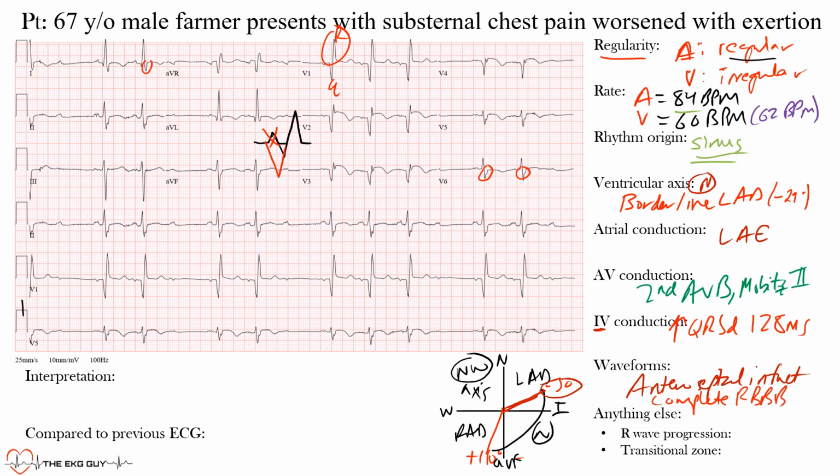All right. Is there anything else? Well, we've hit on a lot already here with the ST elevation that we mentioned in the anteroseptal leads, and the Q waves that were abnormal in those leads, V1 through V4. All right, there's nothing else here. I just want to make a comment on the QTc interval. The QTc interval was actually 345 milliseconds. Now, sometimes in infarcts you can see this prolonged, but here it's normal in this male.